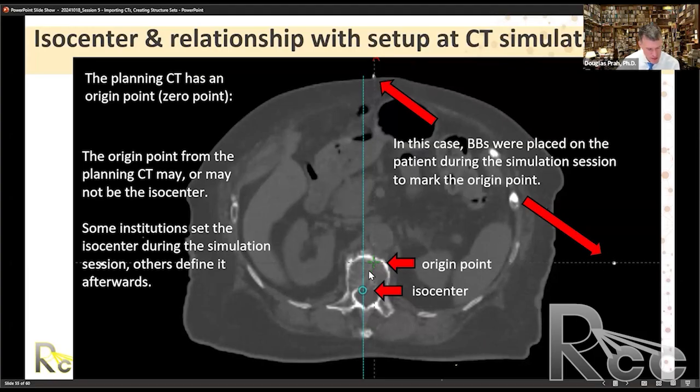It's pretty straightforward. Isocenter, in the case of that spine that we had contoured, I would usually put isocenter in the target. Does the isocenter need to be in the target? Not necessarily, but I think it's good practice, at least for beam weighting and planning and design. There might be instances, for example, where I'm going to treat a vertebral body, but I may in the future have to retreat that patient again because there's metastatic disease in the vertebral body, and I don't want to have the beam divergence to deal with if I have to come back and treat it.